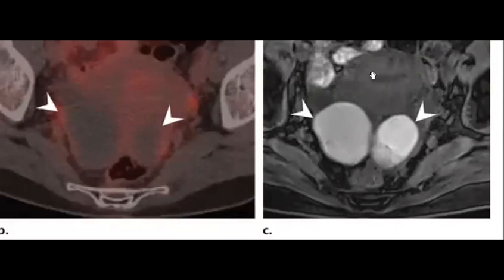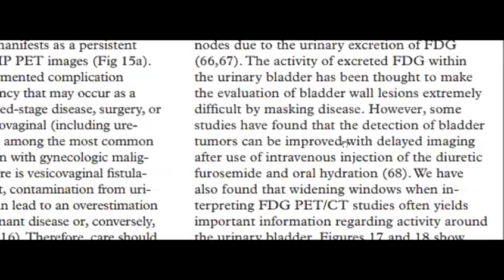Look in the fluid, any fluid signal here. It is low signal, so it is T1, not T2. Okay? Look at any fluid signal. So this one is T1 fat saturation. And when you find the high signal in T1 fat sat, you are talking about hemorrhage mainly. And when you find the hemorrhage, you can check the PET CT on the other side. It is photopenic, so this means they don't have any suspicious uptake. Okay? And this one was endometrioma.